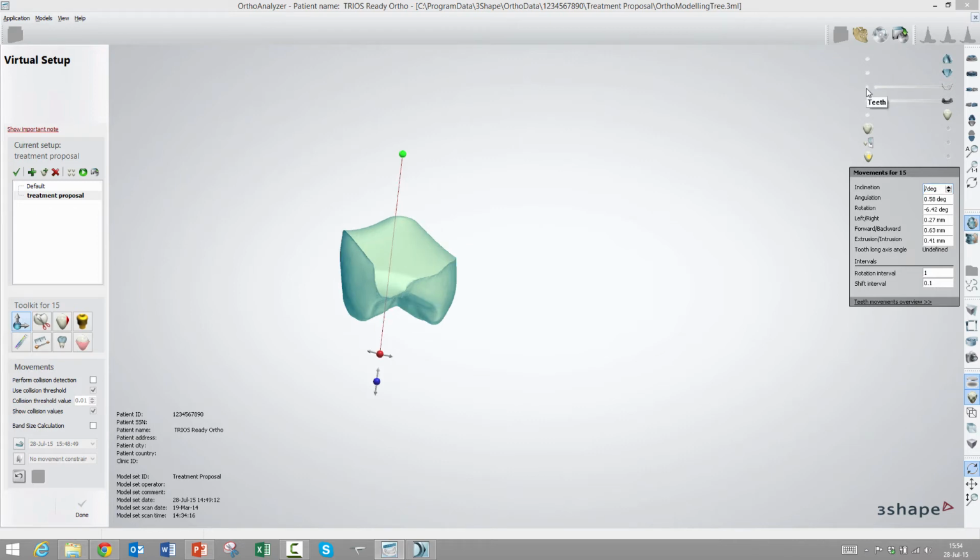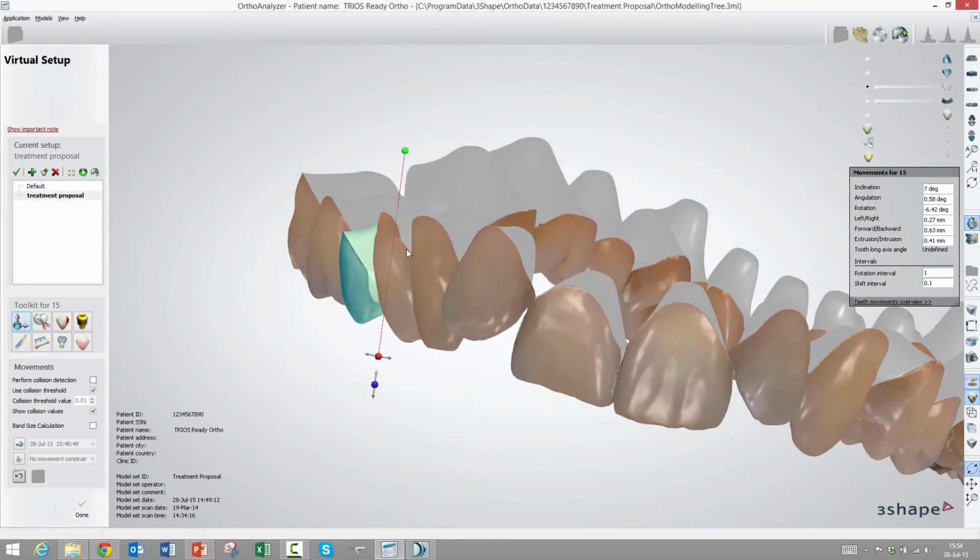Of course, it's not very telling when I don't have any other teeth, but if I put them back on, you will see this effect. And I can adjust it parametrically. So this is quite useful to make sure that you have some control parametric values for your movements. So really 3 methods of moving the teeth, up to your personal preference.